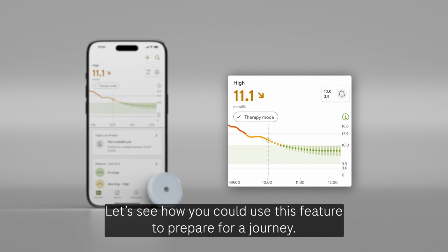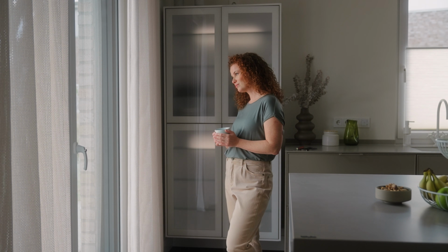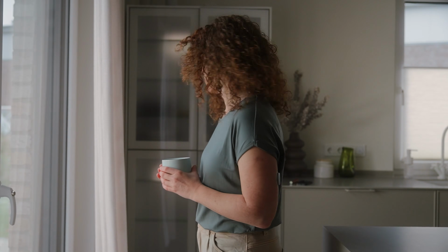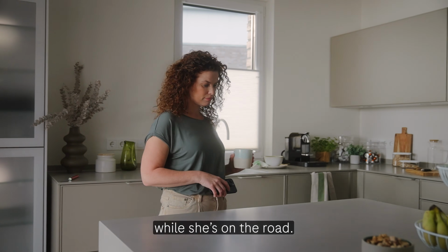Let's see how you could use this feature to prepare for a journey. Meet Anna. She's going to visit her brother who lives 2 hours away, so she needs to get ready for a long drive. Her priority is to avoid having low glucose while she's on the road.